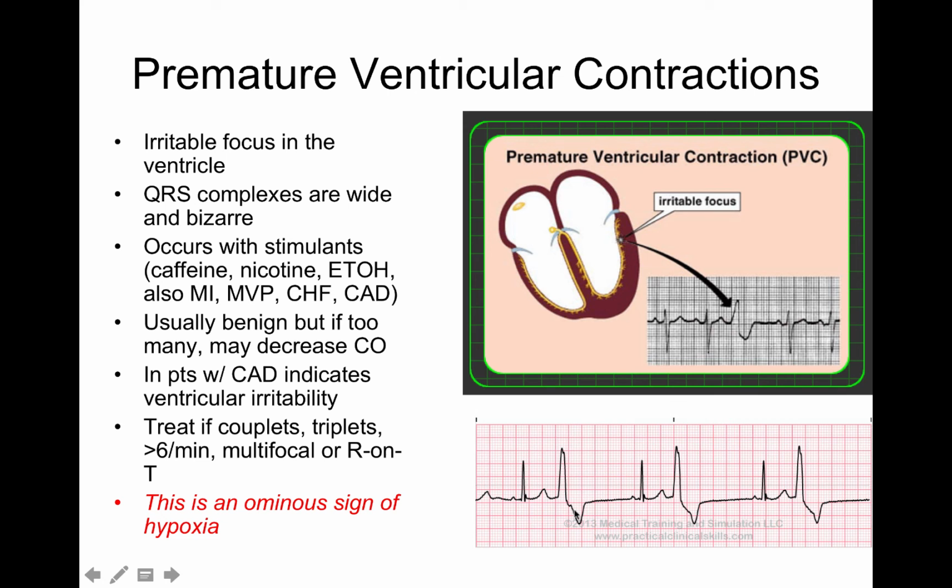PVCs can be unifocal or they can be multifocal. This is very basic, what we're just going over, but you can have PVCs from different focuses. This PVC right here looks the same as that one and that one, so by definition we would call this unifocal.